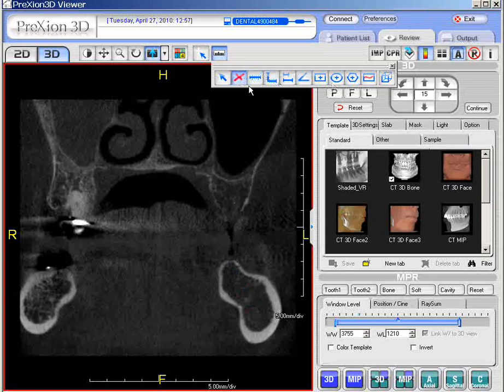If one wishes to keep the toolbar open, rather than closing it, you can hit the arrow, the blue arrow. It says selection. Think of it as neutral. In your automobile, you're in neutral position, but you still have the ability to select these particular functions. So the other thing about the neutral position is, let's say you do a measurement, and we'll go back to what we just did. Left click it, drag, and release. And let's say we want to keep that measurement on the screen.